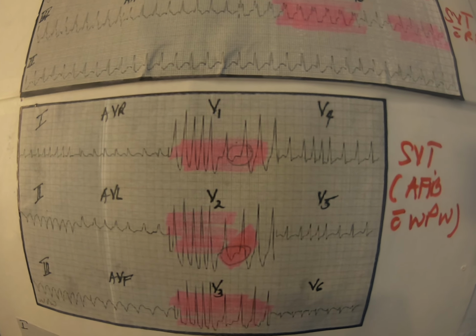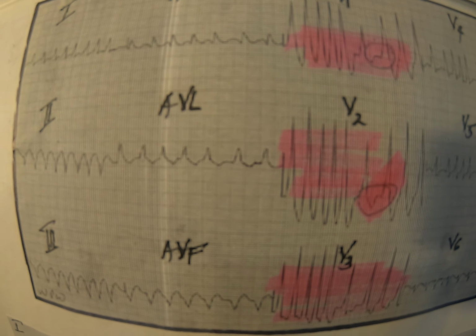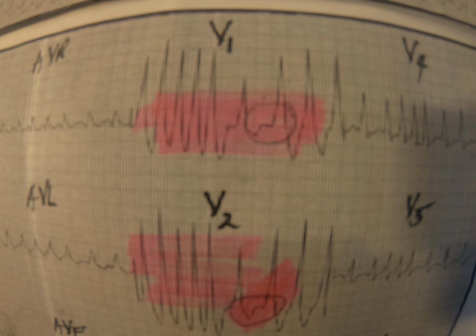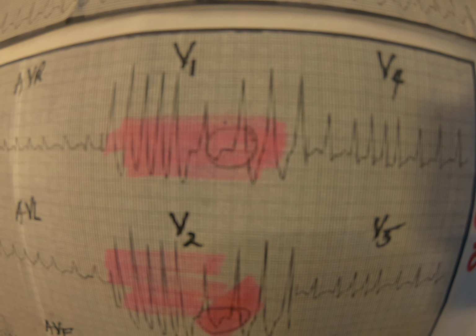We have an AFib with Wolff-Parkinson-White here. If you say SVT, but I see it's AFib, I will go specific to the point. This is AFib with Wolff-Parkinson-White syndrome. So there are wide complexes in here. If you look closer in here, you see there is a delta wave.